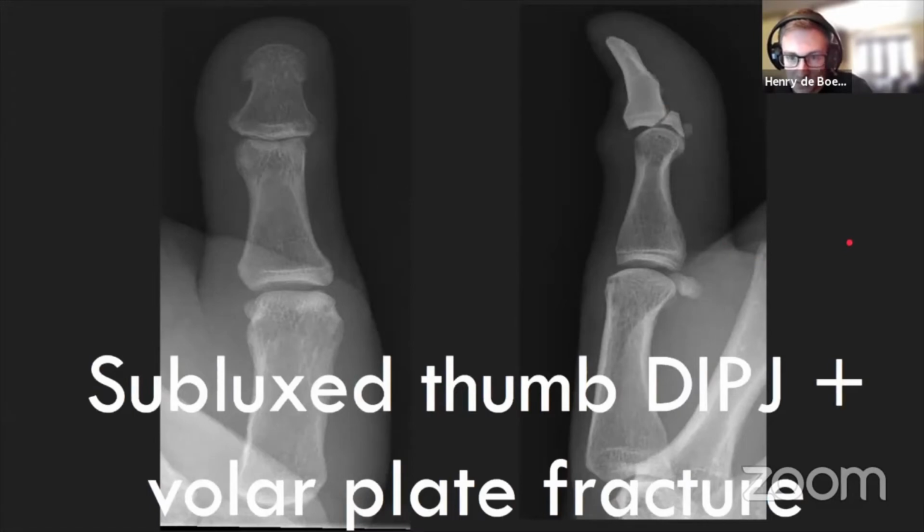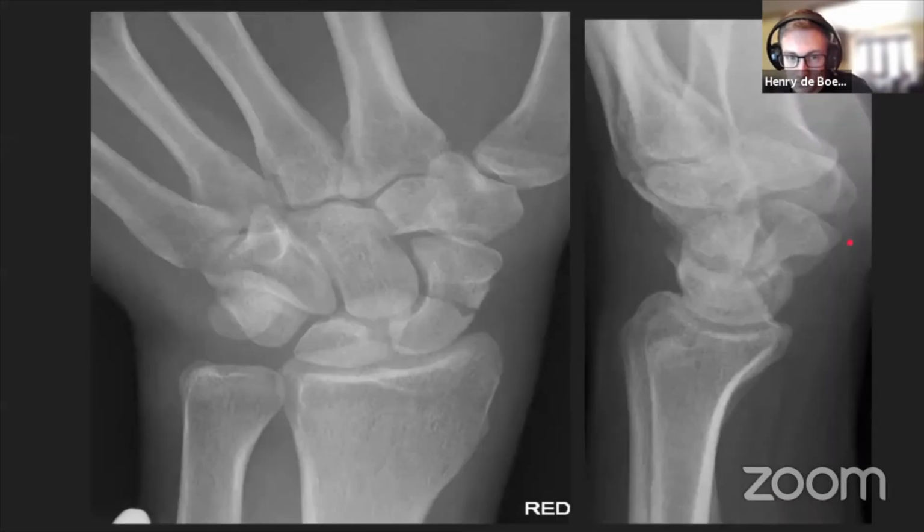Yeah, so there it is. Okay, so next case.